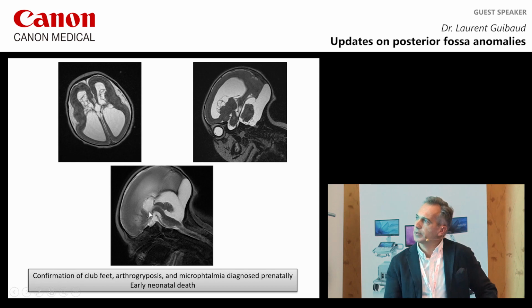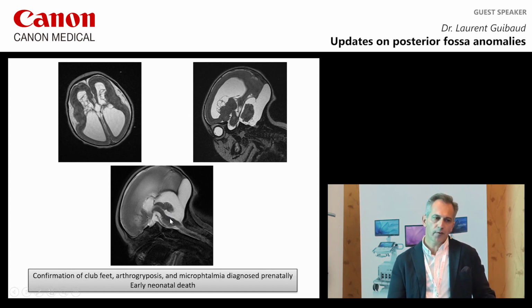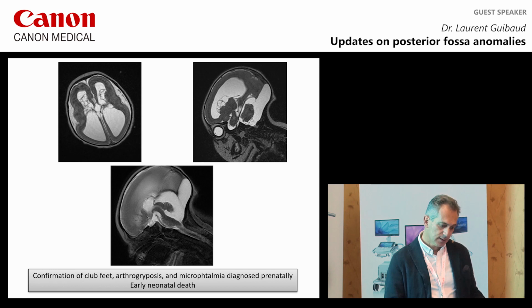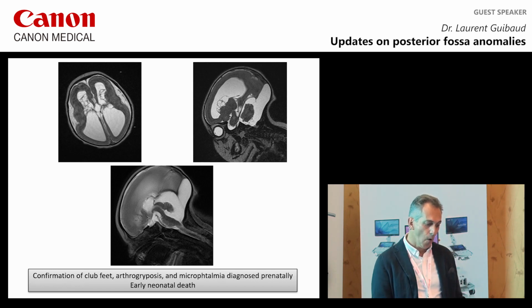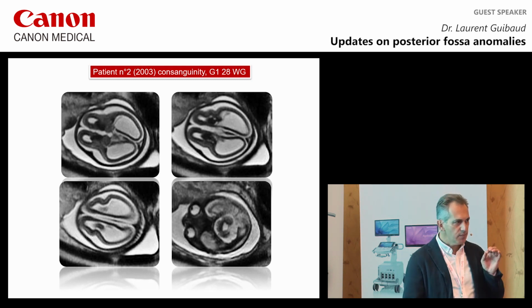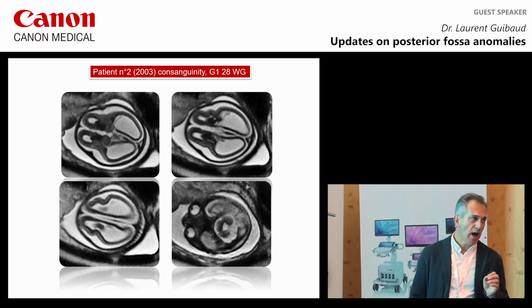And look at the pons. It's very abnormal. And we have confirmation of club feet, arthrogryposis, and microphthalmia, diagnosed prenatally, and it led to early neonatal death.